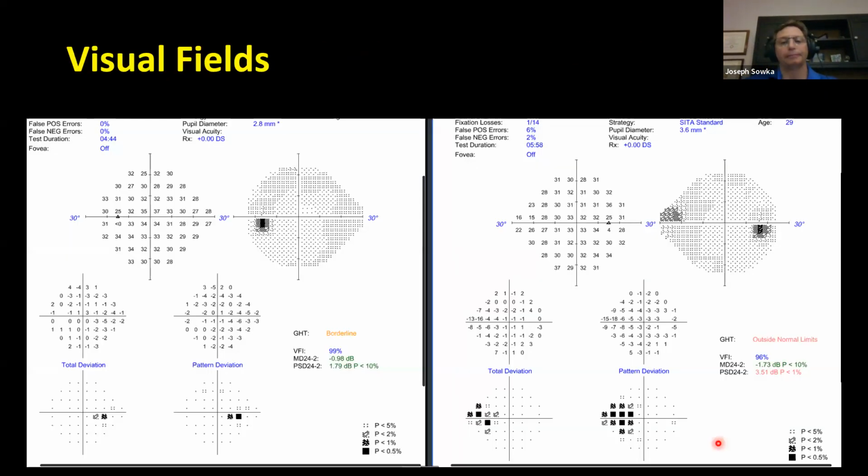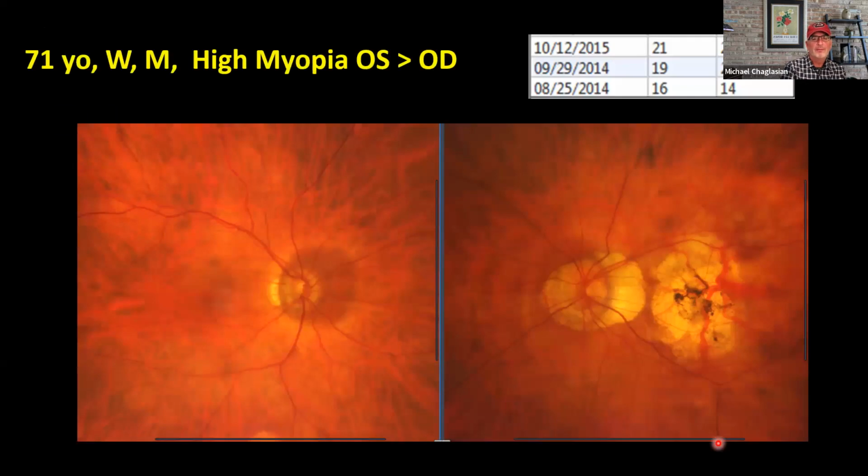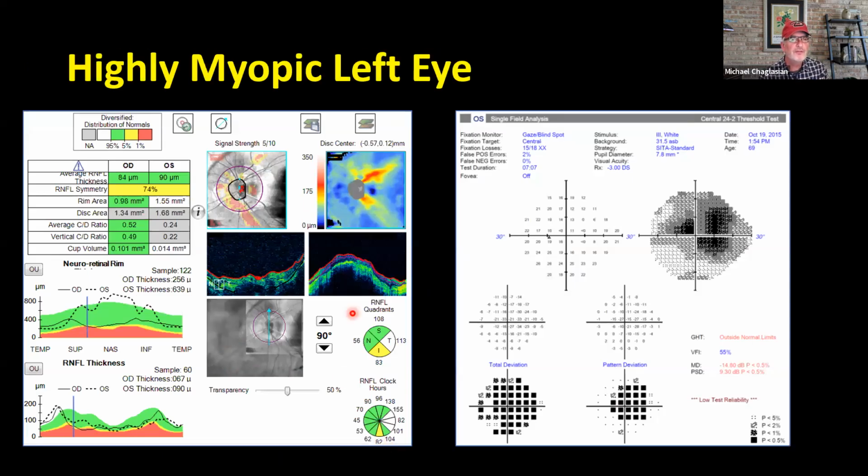Yep. Okay, so that was drusen cases; myopia cases are also things we see every day. Myopes are glaucoma suspects. Some myopes have bad retinal disease, progressive degenerative myopia, staphylomas, macular scarring, normalish pressures typically, oblique and tilted insertion. This is a very high myope. I don't remember how high, but probably 8, 9, or 10 diopters of myopia. These are tough patients. The OCT just does not work for them, and don't even bother on most of these cases.